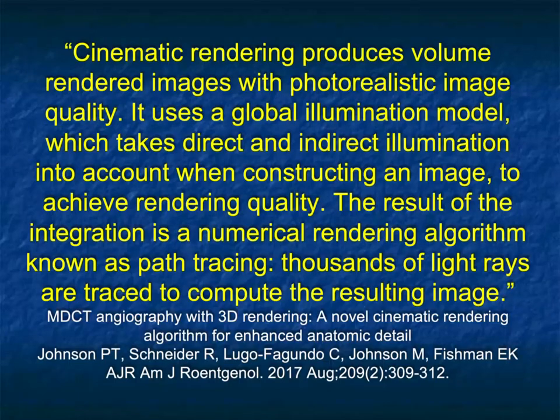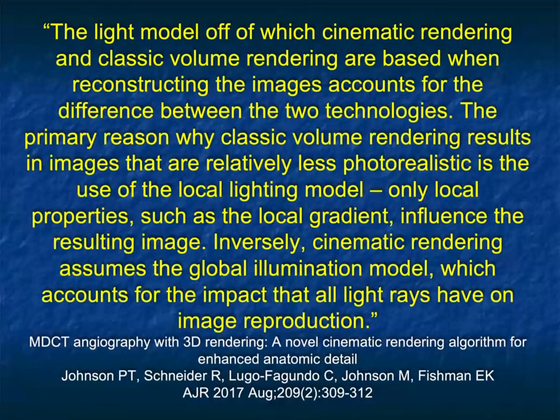And we personally got involved, and here's an article in 2017, very early, talking about cinematic rendering and its photorealistic image quality. We spoke about how we can create these 3D images with thousands of light rays traced to compute the resulting image. We spoke about how the lighting model with cinematic rendering and classic volume rendering, used when reconstructing the image, accounts for the difference between the two techniques.